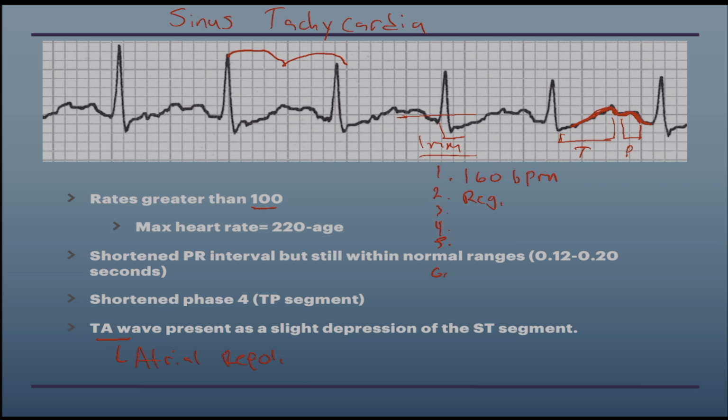Do I have P waves? Well, this gets a little bit complicated, but it actually does look like I can tell this is probably the depolarization. There's my camel hump. So this right here is probably my P wave, and there's my PR interval here. So I do have P waves.